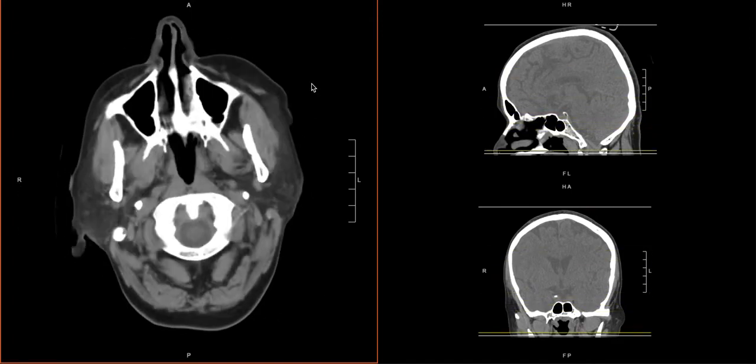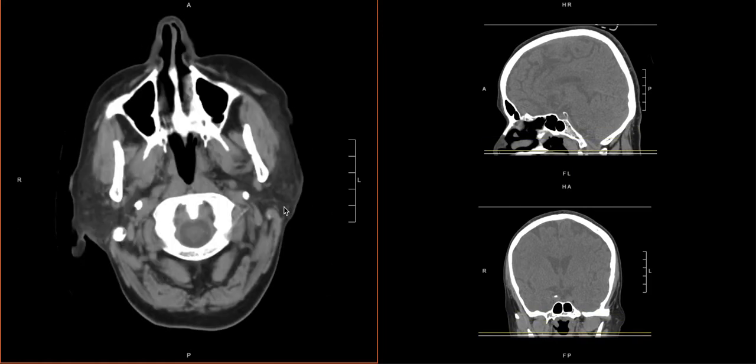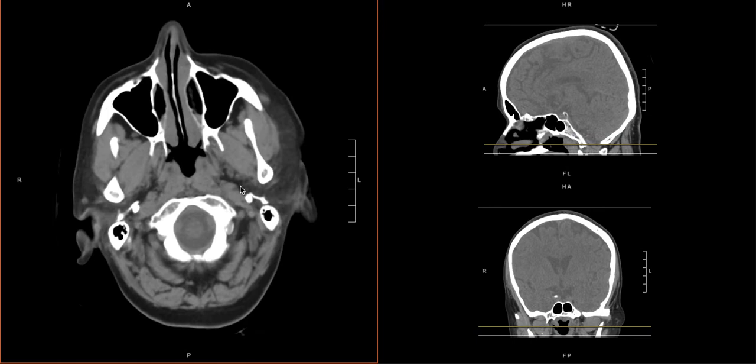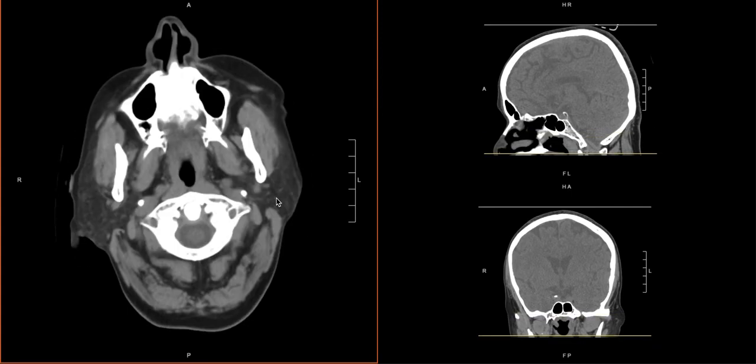Similarly here, coming all the way down, now looking at the parotid on the other side. Again, this is subcutaneous fat density. We see it subtly changes. This is the parotid gland here. We want to make sure we don't miss anything. And if this is where you feel better about looking at the pharynx, hypopharynx, you can make this part of the lateral portion of your soft tissue search. Just make sure you look at the tonsils and these areas here, the musculature back here. Make sure you're not missing anything.